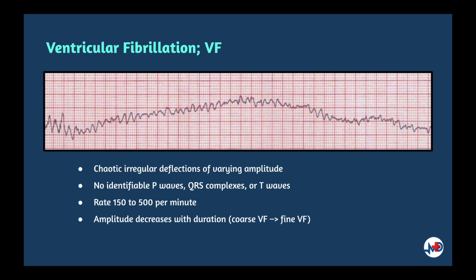Next would be ventricular fibrillation or VF. It's the most important shockable cardiac arrest rhythm. It is invariably fatal unless advanced life support is rapidly instituted. It is chaotic with irregular deflections of varying amplitudes. There are no identifiable P waves, QRS complexes, or T waves.